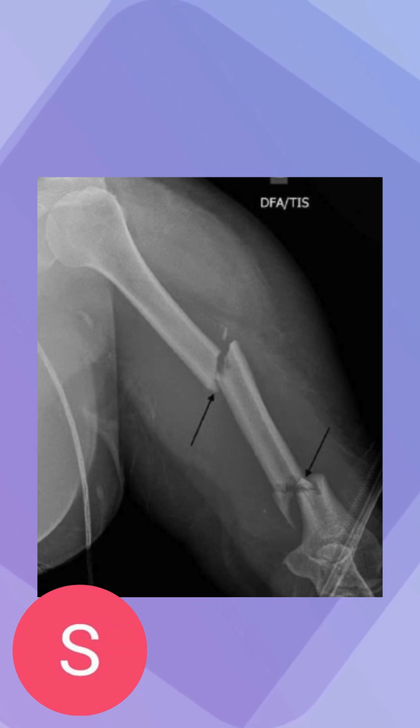If we quickly take a look at this x-ray over here, we can see that it's probably an arm bone. We can tell this because of the rotated shoulder blade. So if we take a look, we can see that ball-and-socket joint attached to the very end. And this seems like a larger patient, because we can see his muscles and everything, and it seems a lot bigger. We can also see that parts of his bones are broken. It's fractured on two ends, and that middle part is displaced, not correctly fixed. So that's something we'll have to look at.